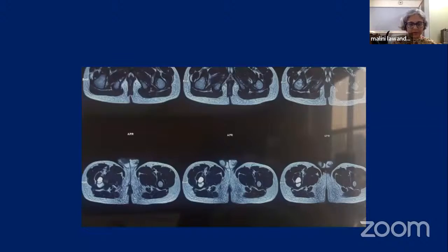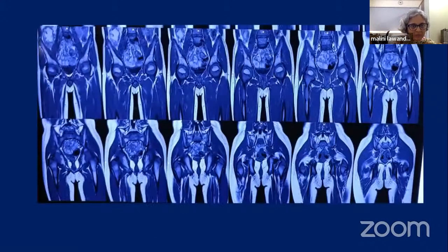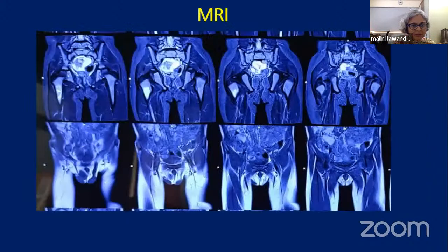Yeah, so this is a cortical lesion, as we saw on radiograph. This is a cortical lesion, very well defined. Again, there is no extraosseous extension. Medulla is normal. If we can just go back, was there any marrow edema? One section behind? One more slide.